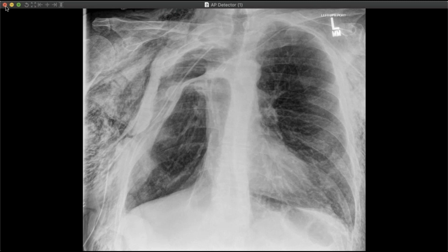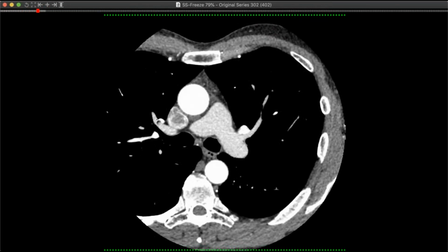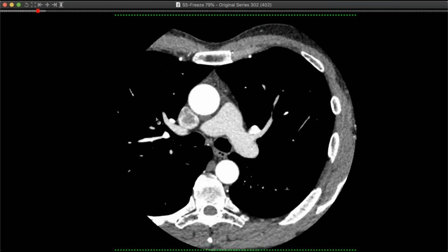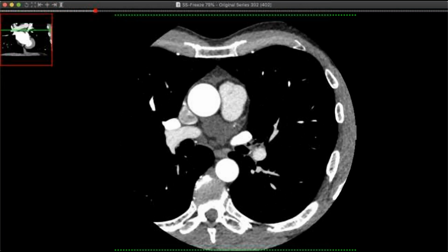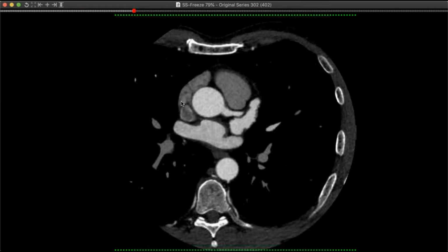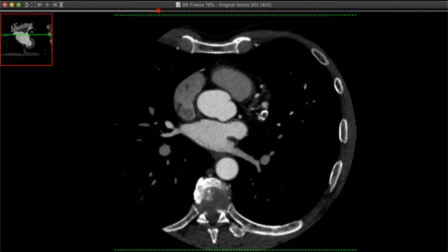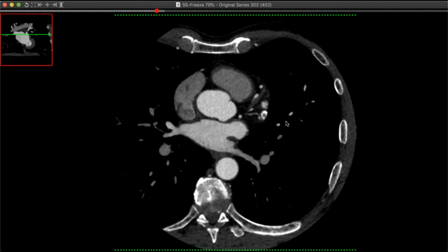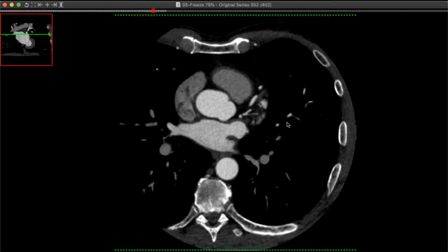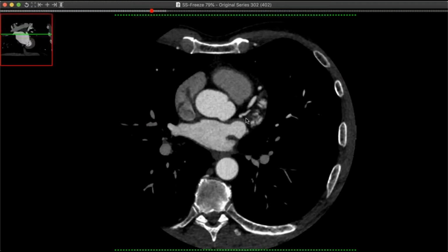So okay, that was a little bit crazy. And then this is a case of, I think, a 50-something-year-old male patient who was having some PVCs. So this was a coronary CT that was done. What was noted on the coronary CT, there's no plaque, but if you follow the left circumflex down, you can see this little branch, maybe an OM branch right there coming off the circ.